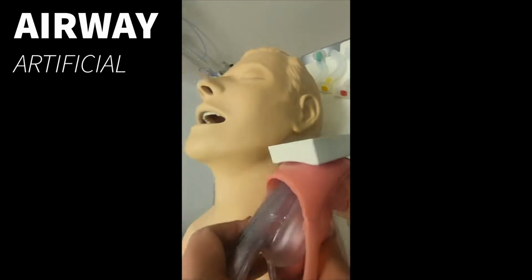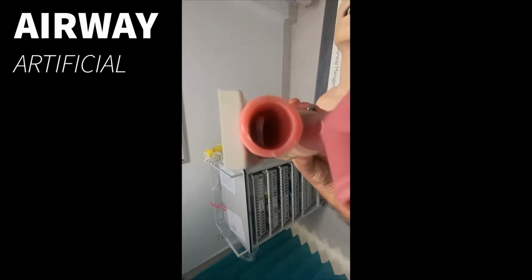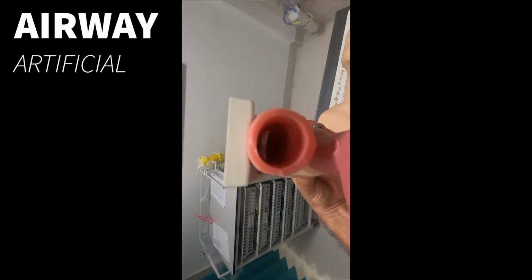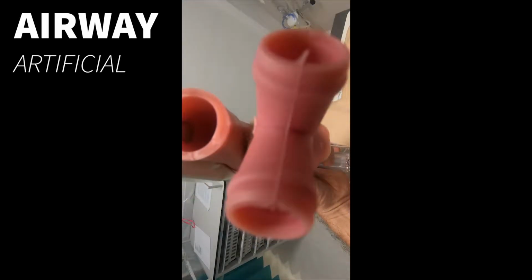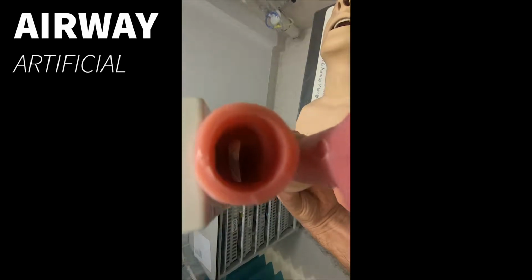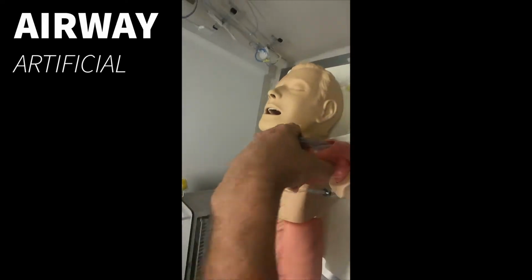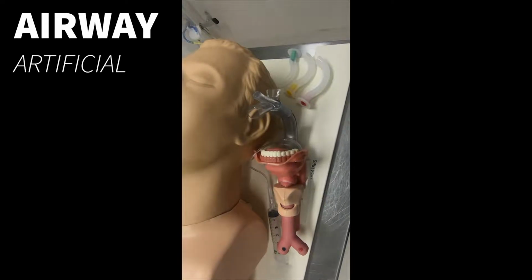So if I pick up this model and I look inside, it's not the best, but you can sort of see towards the end there is the laryngeal mask. And you see the airways are free. Well, could be better. Have to come to the face-to-face session. Alright, so that's the laryngeal mask airway, and I'll show you a better video in a second.